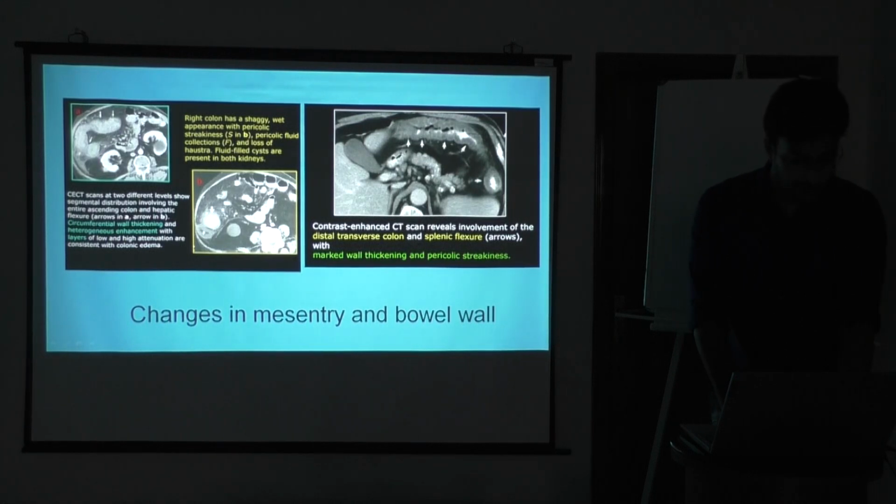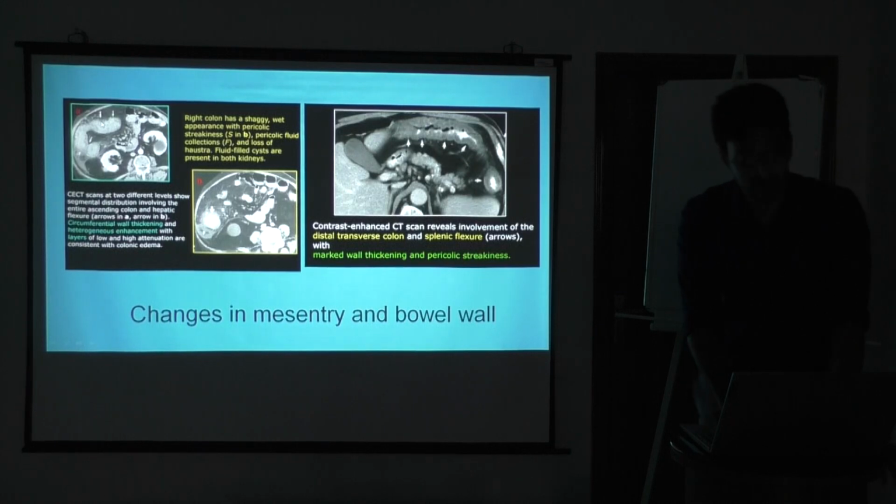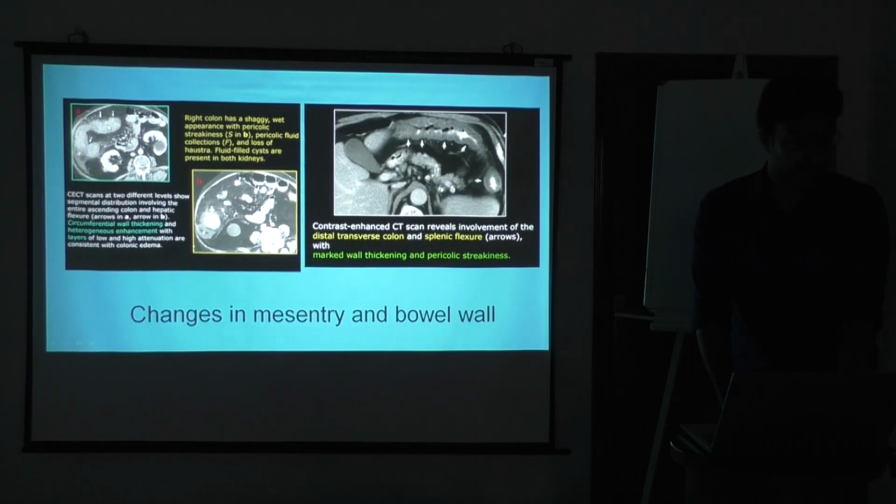You can see this part of the bowel, this is normal. So one line of white thing is there around, that is enhancement of the normal bowel wall, and this is the gas. So you can see in this bowel, you can see different colors of grey color. So that is abnormal, and there is no gas, it's completely collapsed. So in this case, the description is, you can see mural enhancement is lost. That is a terminology to say there is ischemia. So normal contrast is not entering, and certain layers of the bowel wall are hyperemic and certain wall is less enhancing. So that's an abnormality.